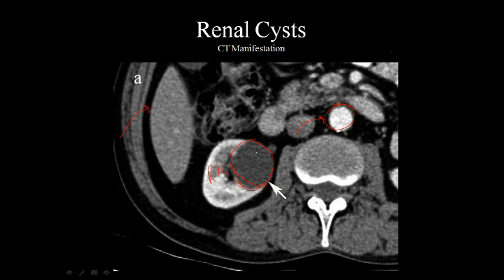That can be borne out even further by taking a density measurement here and then here, and we can see that it's close to the density of water. Notice we have air here, and the inferior vena cava has a little bit of contrast in it, but if it had no contrast in it, blood would have slightly more density than water, but it'd be close to water. And so we could see that the cyst is pretty much what it implies, just a cyst and nothing more.